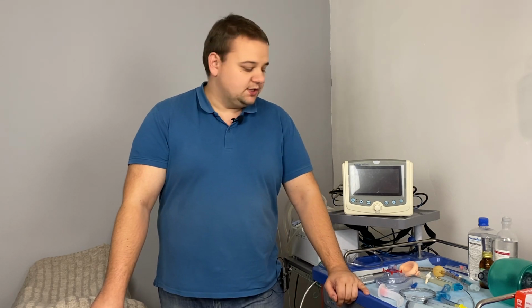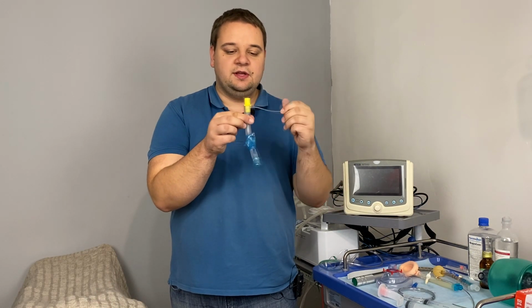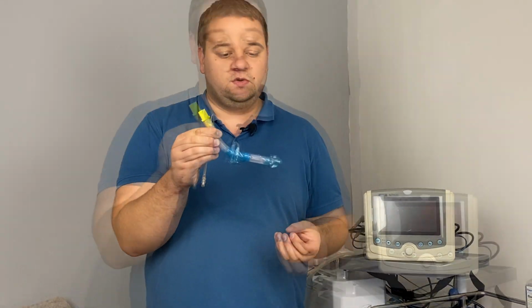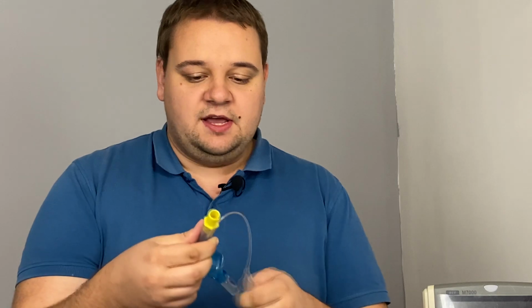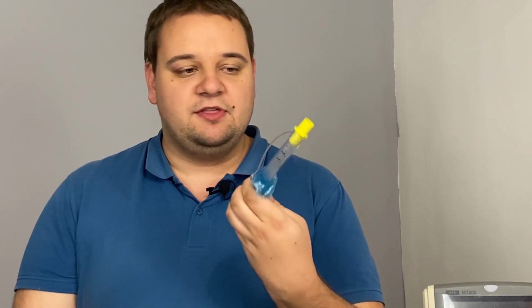Then more complex devices. You see, the oropharyngeal tube only works with the tongue. It does not prevent any aspiration. So that's why we needed further development. This device is called the laryngeal tube. Laryngeal is from the word larynx, so it's a tube which does something with the vocal cords, but of course it doesn't come directly inside the vocal apparatus. There are 5 sizes of these tubes. This is size number 3.